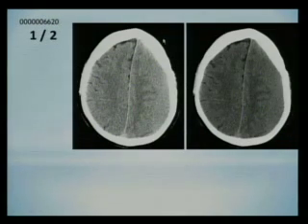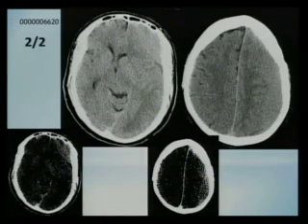Now you might say, Dr. Hardja, you just said that hemorrhage is bright. Well, yes, if it's acute. If it's subacute, it starts to become less bright. Or it can still be acute, but if the patient is severely anemic, like a hemoglobin of 7, 9, then the acute hematoma might look something like this. And with different windows, you can see a little bit better.